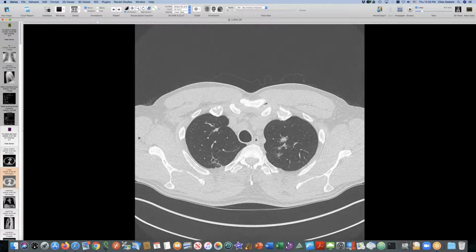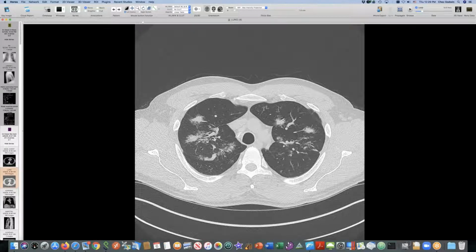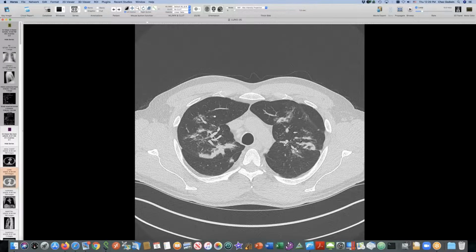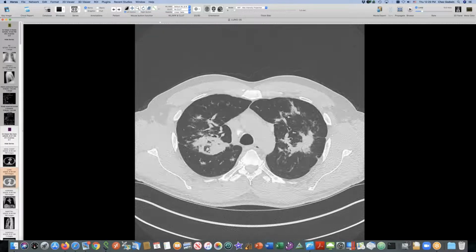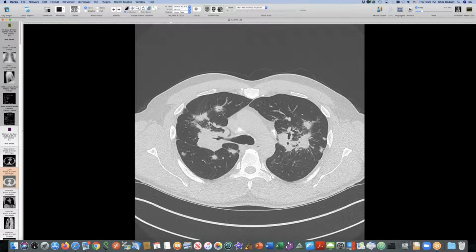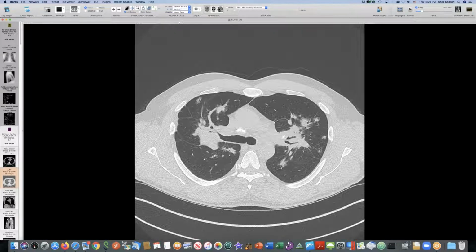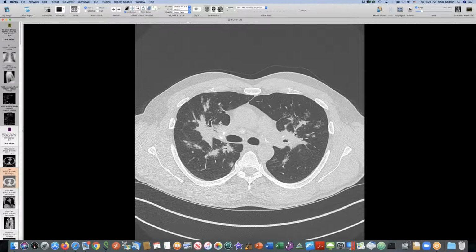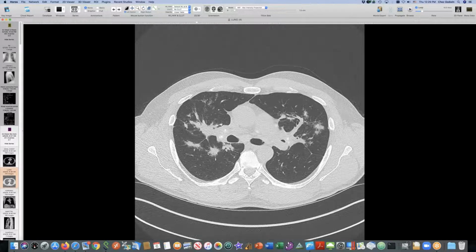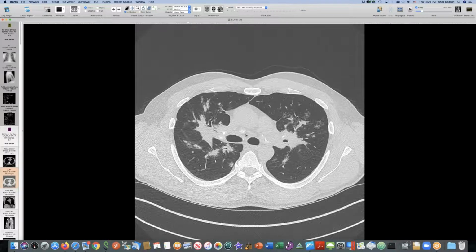And so, I mean, this is a great case of these nice galaxy signs here. So is this a classic case of sarcoidosis with some progressive massive fibrosis here, some conglomerate masses that are forming centrally and are sucking up these smaller things with time, and some calcified lymph nodes, like in that last case? That can go with silicosis, but it's just fine for sarcoid too.